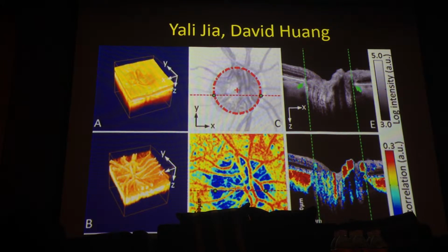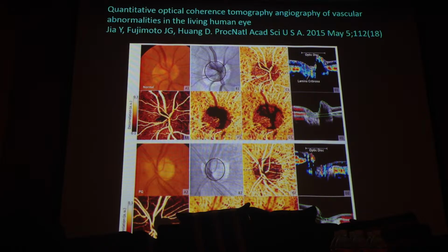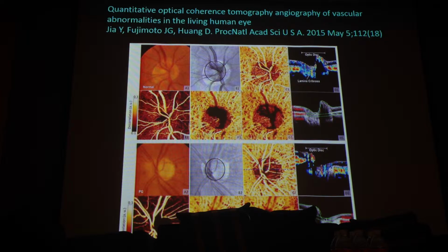will separate all the different vessels, and probably with techniques of subtraction of the big vessels in the analysis around the disc. They propose this kind of presentation with a 3D reconstruction and attenuation of the big vessels.